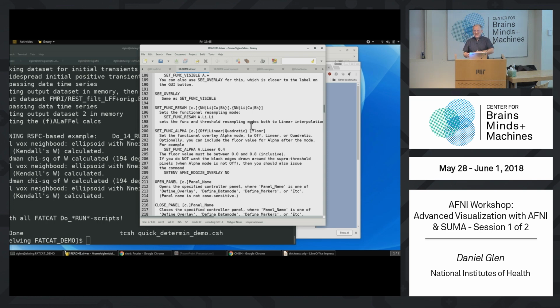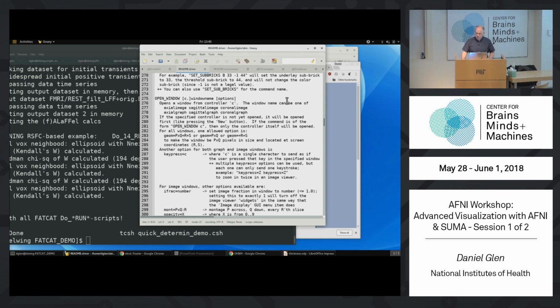Either you can take advantage that when you're doing this, AFNI is still interactive as you're doing it. So if you want to look at some other aspect, you can do that, but you can direct your users, if you write it for somebody else, to always look at the same thing. You can have it for yourself so that you always look at this slice and save some slice as a quality control image. So these kinds of things are very useful for viewing and for quality control tools. Okay, so let's go through that.